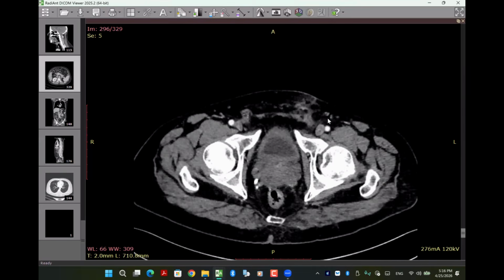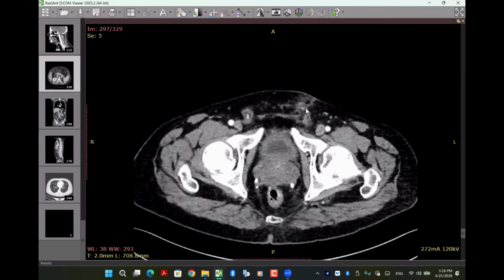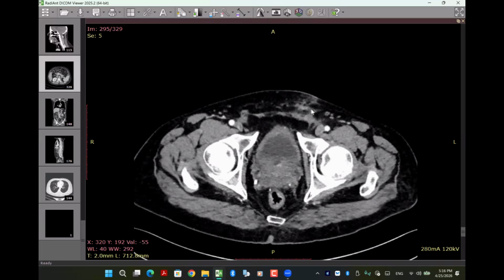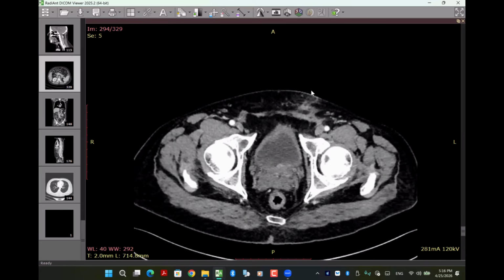Sir, these are post-surgical changes. Excellent. What can cause this infiltration and haziness? What is this? What is the anatomic location? Sir, it appears to be the inguinal canal. Excellent. Okay, what is this? Yes, so this is post. Can we scroll? Sir, is it post orchidectomy? Nice, excellent. This is post left orchiectomy for this case with spermatic cord removal, and this is the post-operative.